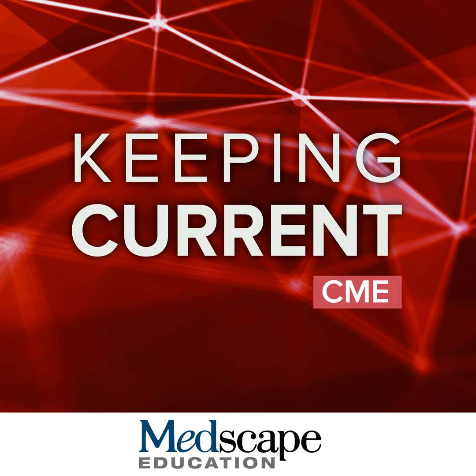So how does late gadolinium enhancement work? If you consider that we inject the contrast, as I mentioned, you try to inject the contrast at the beginning of the protocol to speed up the overall protocol. When we inject the contrast, in normal myocardium, the contrast washes in and washes out. With ischemic myocardium, the contrast washes in and washes out, but you just get less uptake in this area of ischemia.